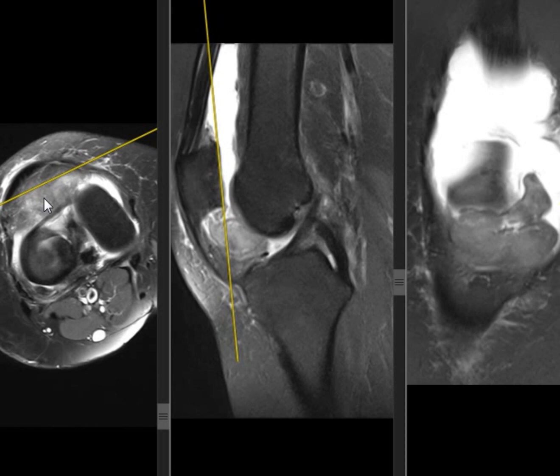Contrast. We should have contrast. Unfortunately, the patient refused contrast. Of course, no one asked for contrast. No one asked for an X-ray. I always tell you, when you have a musculoskeletal image, you ask for an X-ray. I will tell you I don't have it, but you should ask for it. Then, could it be synovial hemangioma?